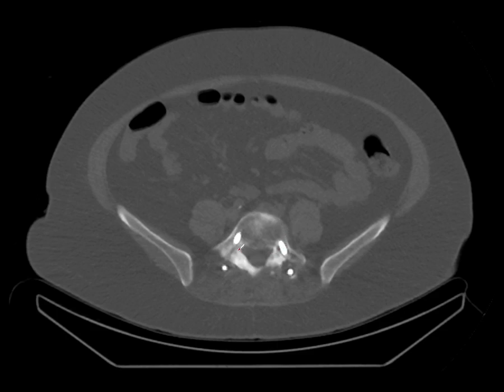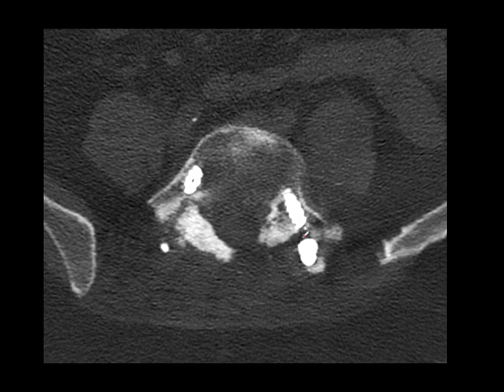CT only image, you can see, however, that there is a fracture here in the region of the posterior elements. And the patient had a high resolution CT scan through the area which confirmed this. So this is a patient who has a fracture in the posterior elements close to the pedicle screw, and that was considered to be the explanation for her pain. So this just shows you once again how SPECT CT, when used correctly, can help us to localize the site of a more general abnormality.